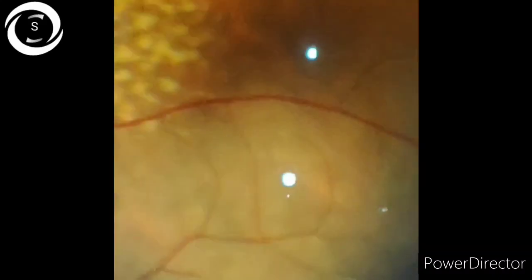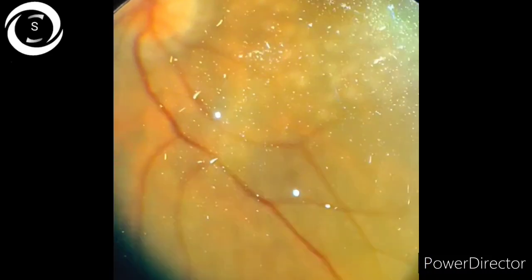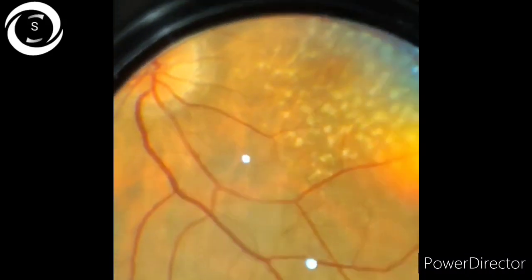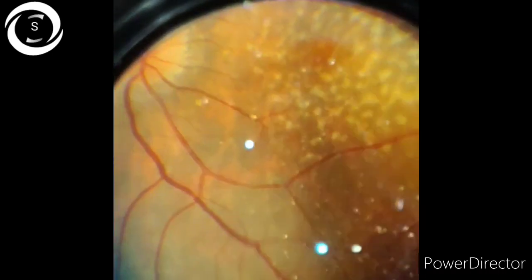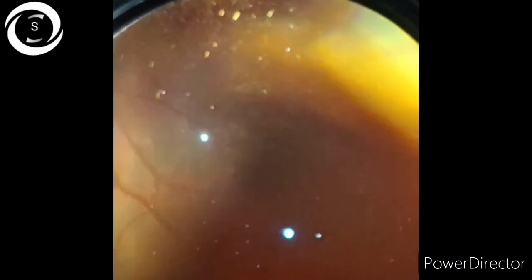Now depth of the lesion is also very important. If you look closely, you will see retinal vessels going above the lesion, so it confirms that these deposits are deep, somewhere around the level of RPE. From this discussion it is now confirmed that these could be drusens. Now what are drusens? Drusens are extracellular deposits located at the interface between retinal pigment epithelium and Bruch's membrane. Drusens are formed from immune mediated and metabolic processes in RPE.